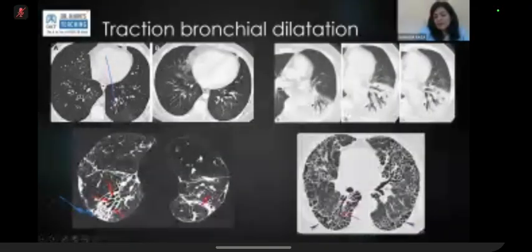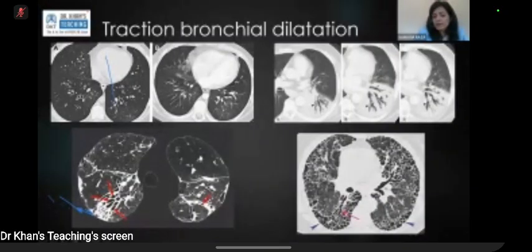Because a patient can have ILD and primary bronchiectasis, if somebody has a mild ILD or mild reticulation that is very clearly more than would be expected for dependent change, the question is, well, does the patient have underlying bronchiectasis as well? That is when you look at the morphology or the appearance of that specific bronchus.